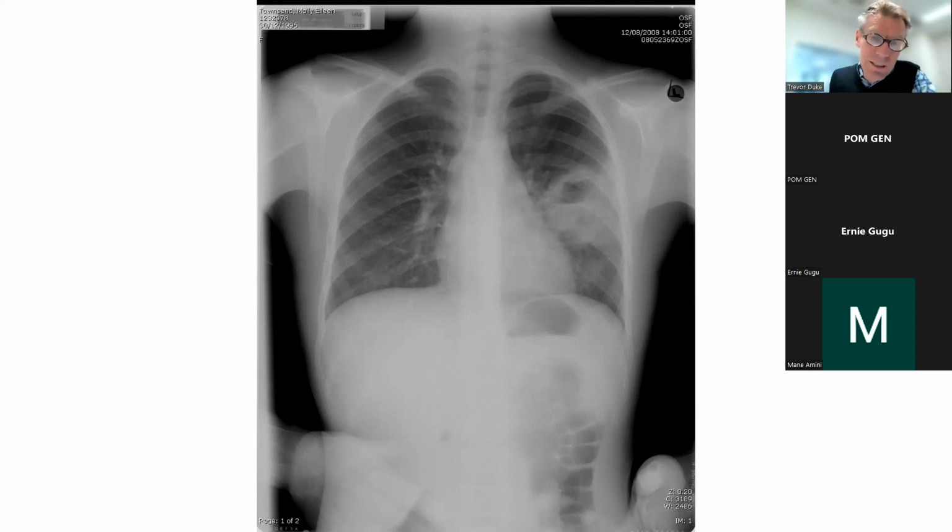And I would have said, Benji, that if the left lung looked like the right lung, I'd say, well, that could be normal, because you can see the right heart border, you can see the hemidiaphragm, you can normally see some bronchovascular changes in the right hilar region.